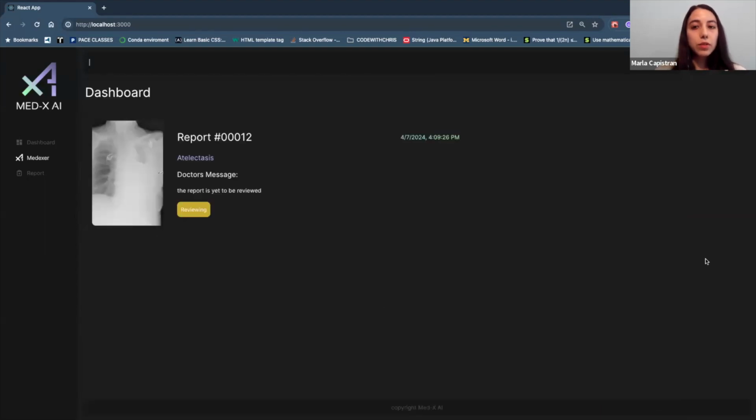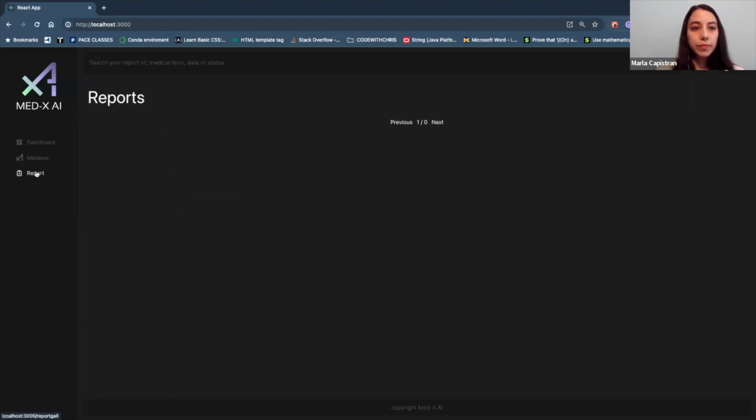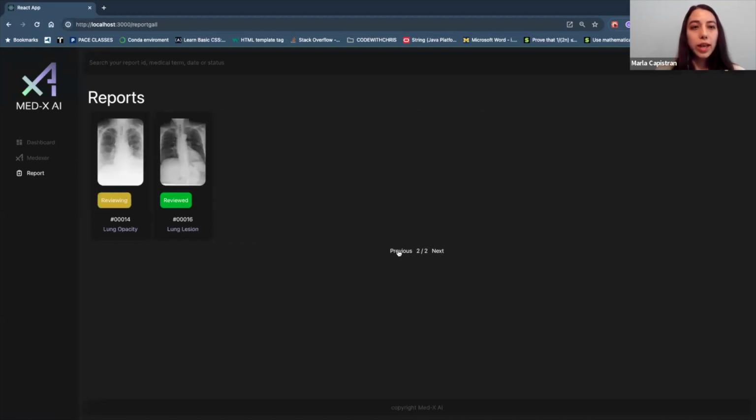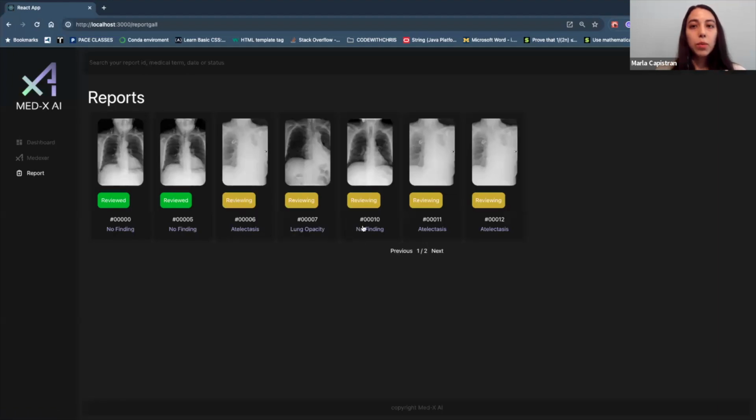As a quick glance of all the reports she has submitted, Angela can click on the Report tab. The reports are shown as thumbnails with their respective report ID, diagnosis, and report status. When clicked on, you will see the report details.